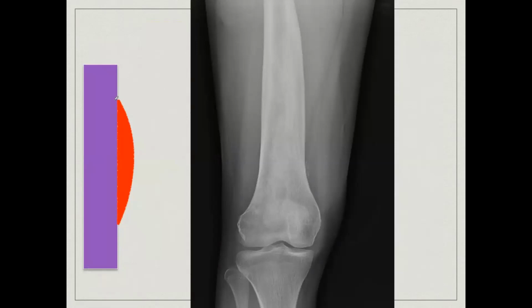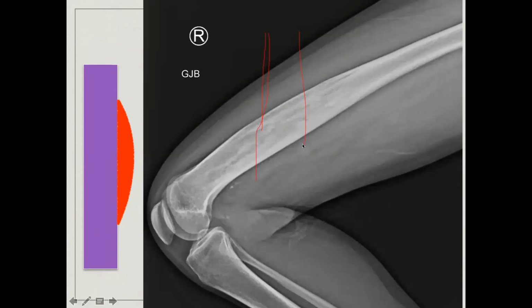So in this case, this is a solid periosteal reaction. You can see that this deep thing is your cortex, and this overlying thing is a thick solid periosteal reaction on either side. It's so thick and homogeneous. So it is kind of a solid periosteal reaction, which suggests that the pathology is usually a non-aggressive pathology.